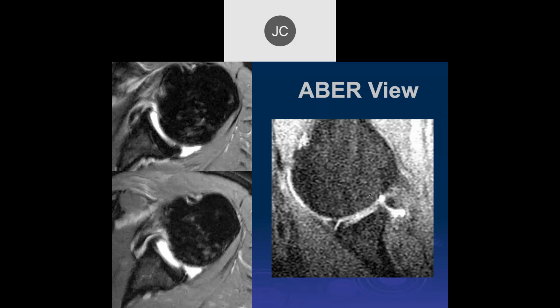It does give you a lot of ability to look at this posterior superior portion of the joint space, which we know is an area of internal impingement that athletes get, that we've already talked about.